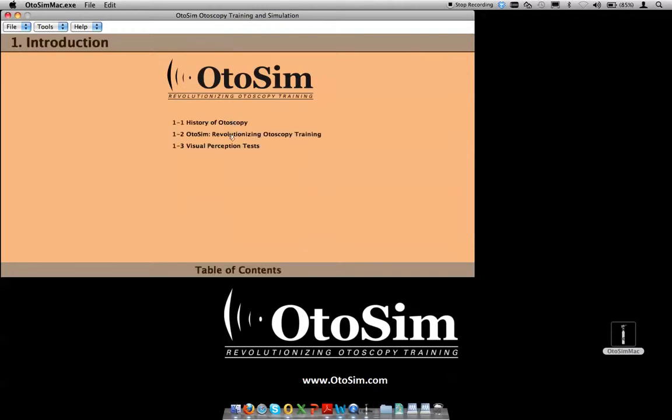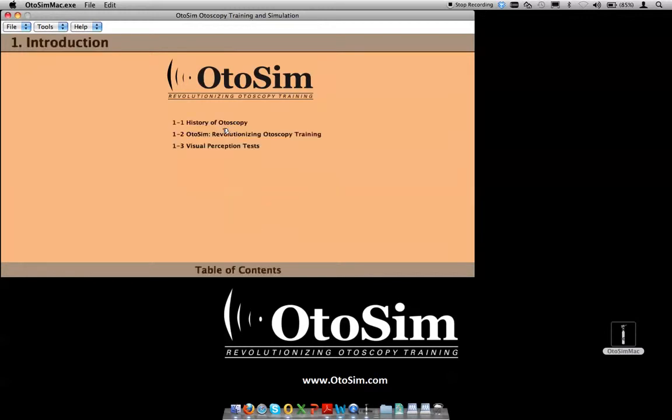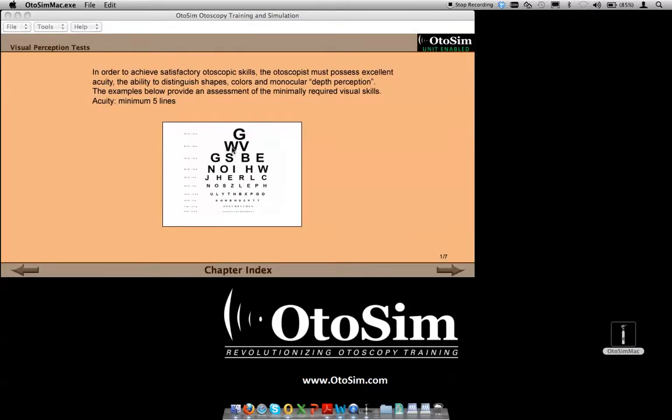The introductory section has 3 topics. You'll notice there's a button at the bottom for table of contents. That'll take me back to the table of contents. And again, by clicking on one, back to the introduction. Just wanted to give you a quick introduction to some of the visual perception tests.